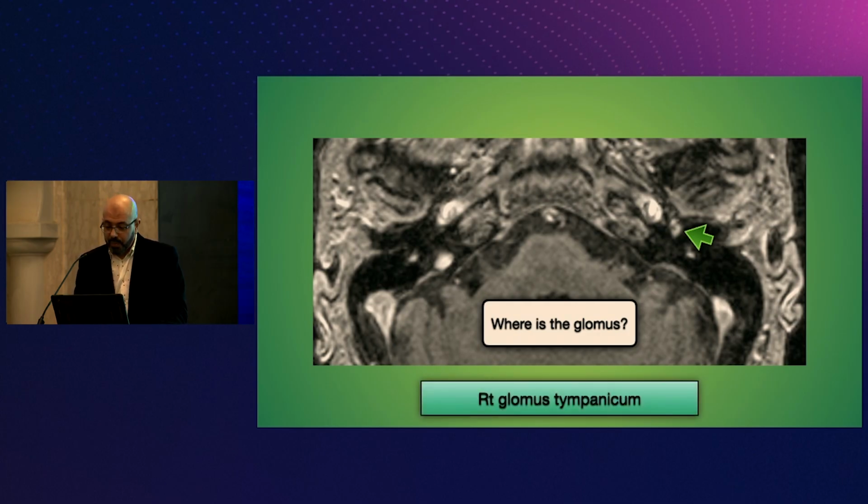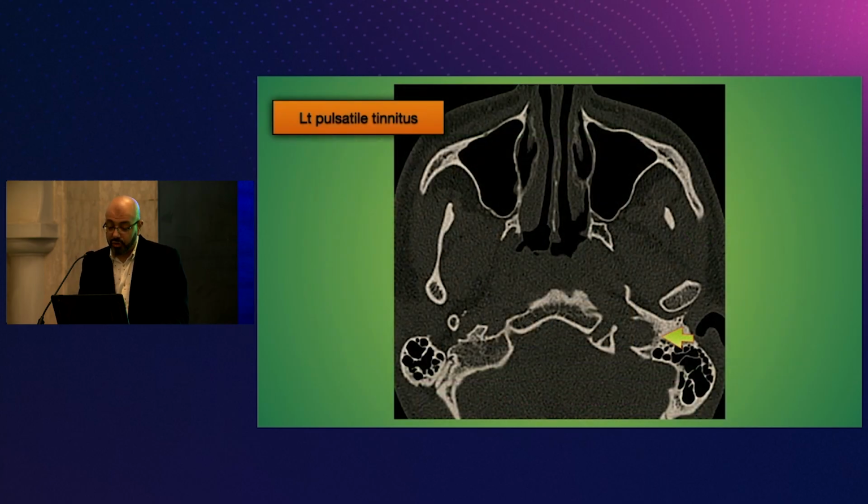Another patient with left pulsatile tinnitus. So what's wrong here?